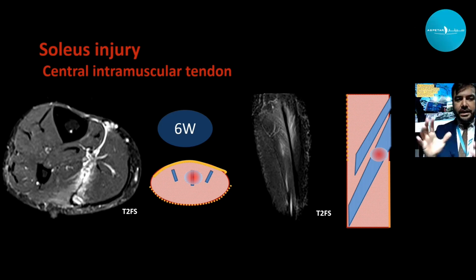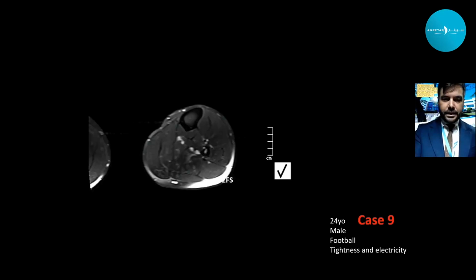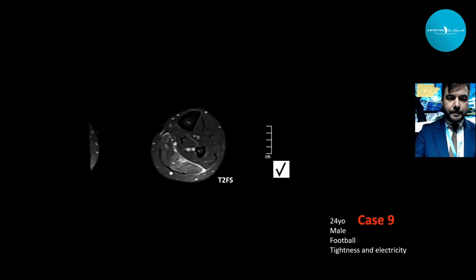Here in this picture, we can see the central tendon involvement, large connective tissue involvement, longer return to play, 6 weeks. Next case is a 24-year-old male football player with tightness and electricity feeling.